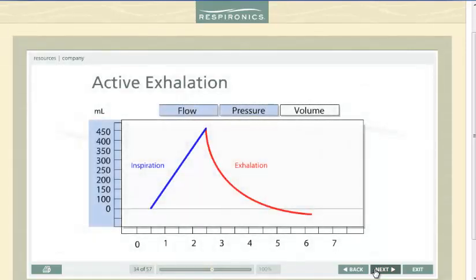When exhalation, shown in red here, drops below the baseline, it usually indicates forced or active exhalation. Also, if the patient has auto-PEEP due to an increased respiratory rate, then relaxes for a few breaths, more exhaled than inspired volume may be seen.